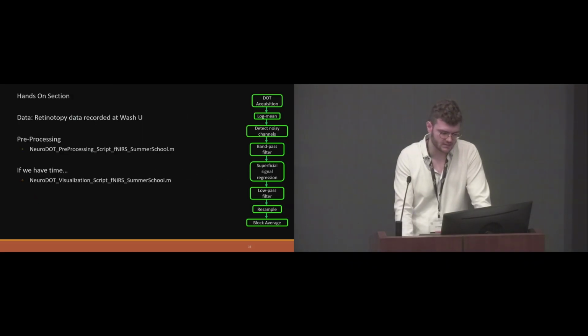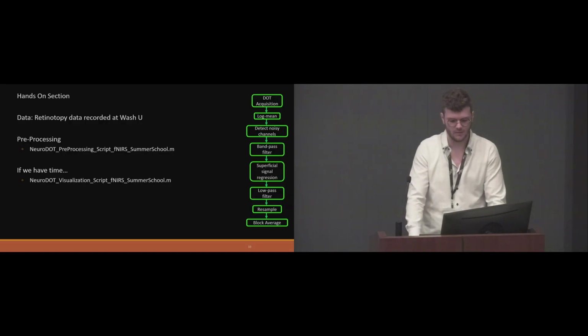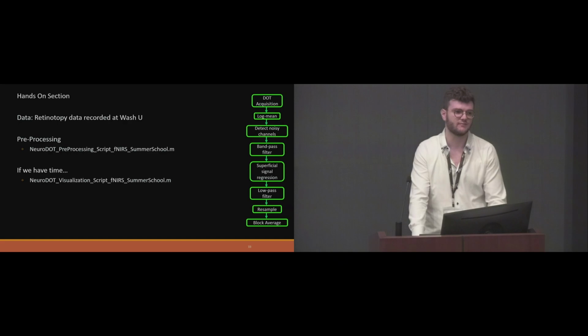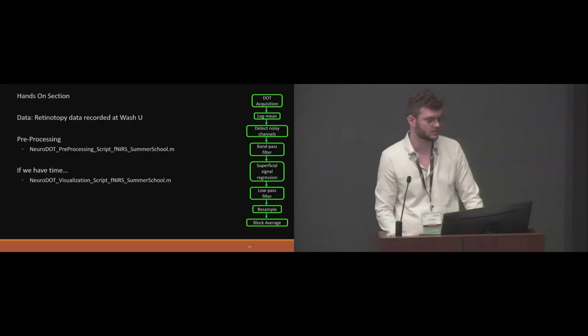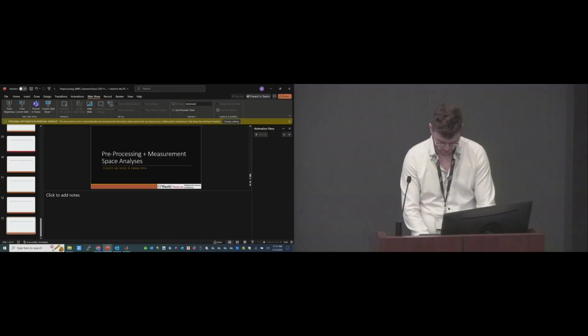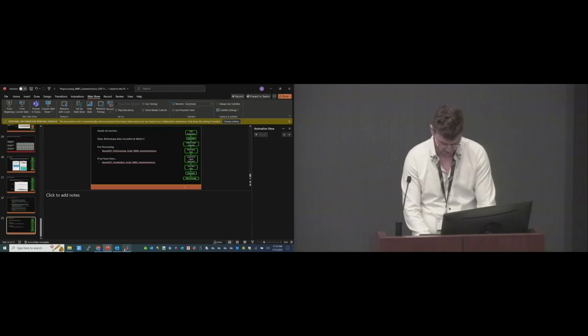For our hands-on section, we're going to be using the same retinotopy data set. You guys are going to be creating a lot of the figures that you've just seen in my slides. I'm going to ask you guys all now to open up MATLAB. We're going to transfer over to there for some pre-processing, and then if we do have time afterwards, we will try out the visualization script. All of these are located in the same box folder. So I'm going to exit out of my PowerPoint and open up MATLAB.